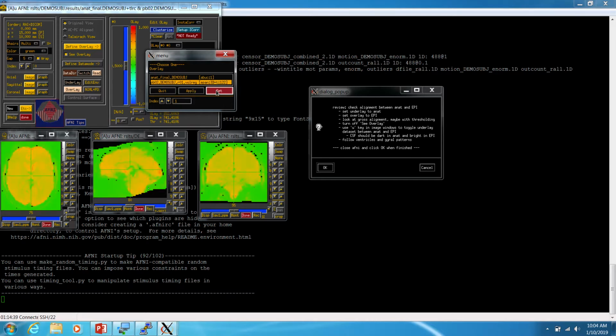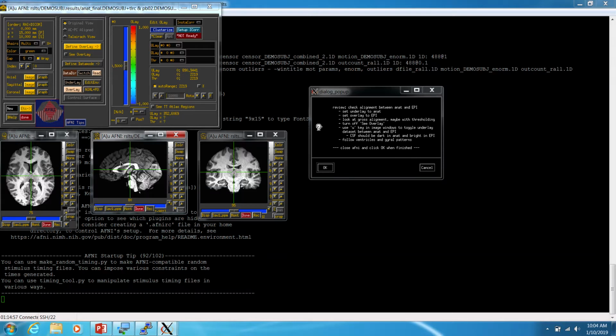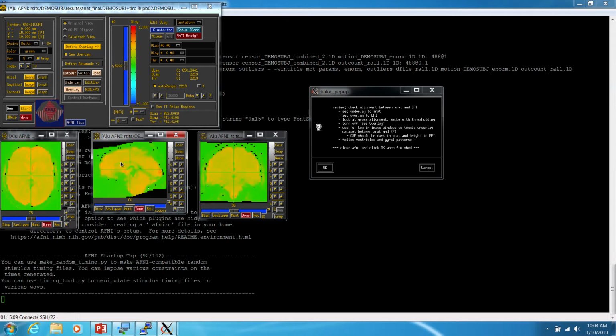Okay. So then what it wants me to do is to essentially flip between these two values, which you can do with the U key. I actually end up using the O key. But basically the idea is if you press this, it turns the overlay on and off. You can also do it the other way, but I find it not as clear. So you can also use U to flip between two images.